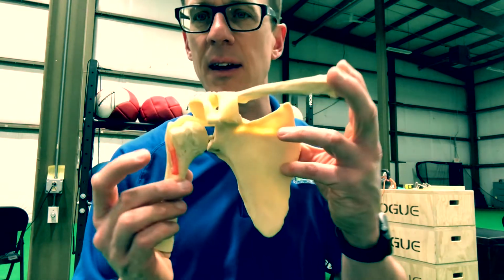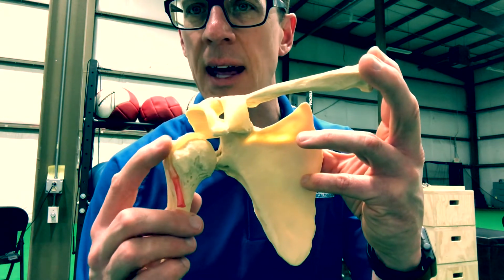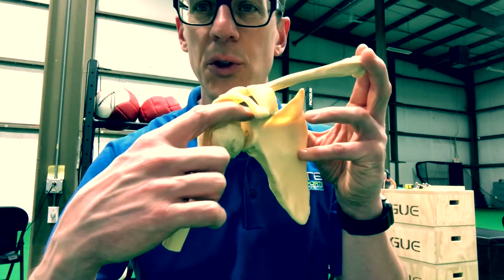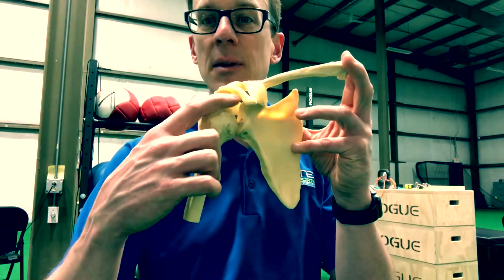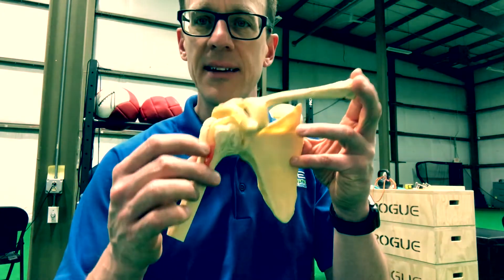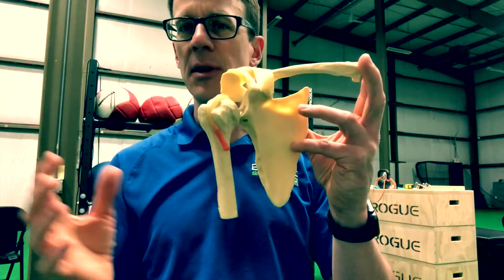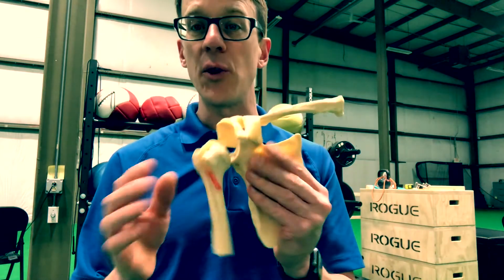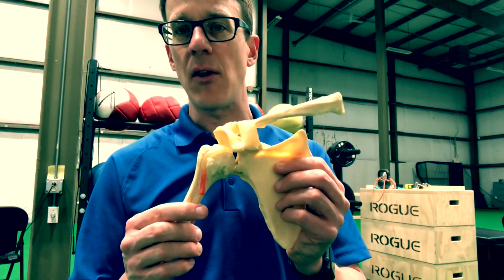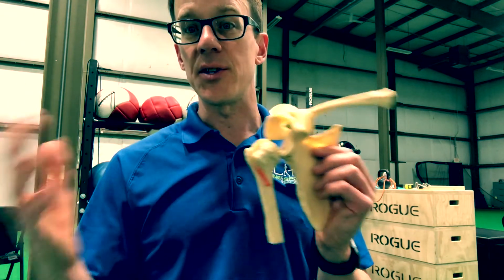That little red thing there is your biceps tendon. That's the long head of your biceps, which actually goes all the way across your shoulder joint and attaches to your labrum. So oftentimes this tendon itself gets banged up with overhead activity, and that's pretty much the structures that you'll see noted on your MRI. Those are the types of injuries that they'll diagnose through an MRI, and I hope that helps you understand what that scan may have read.